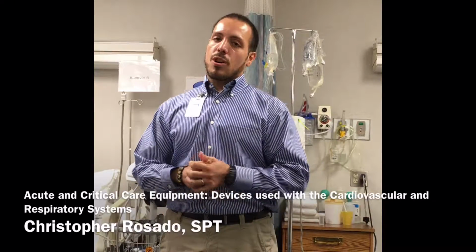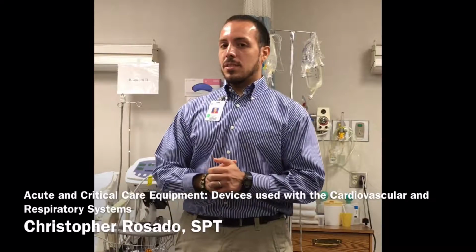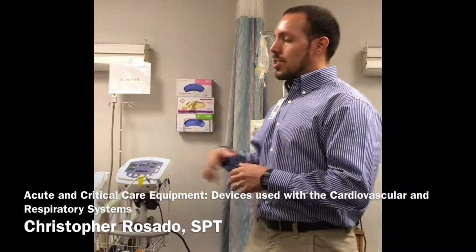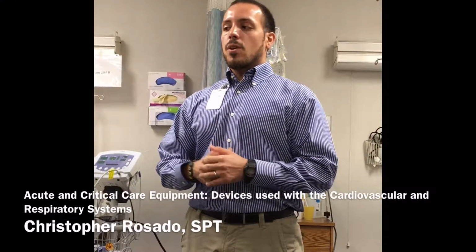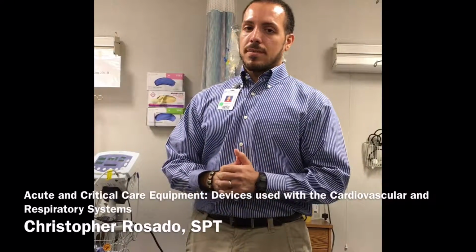This is acute and critical care equipment, devices used with the cardiovascular and respiratory systems. So I have some of the equipment here with me today, and we're going to be filming each and every device, and I'm going to give you a generalization of what we should be looking for and what we might do or interact with them as physical therapists.